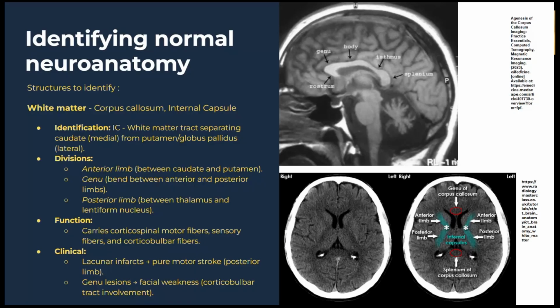And then the corpus callosum. Does anyone know what the function of the corpus callosum is in the brain? You can put it in the chat or just use the mic, it's fine. Yeah, so communication between the two hemispheres, good. The two hemispheres of the brain.